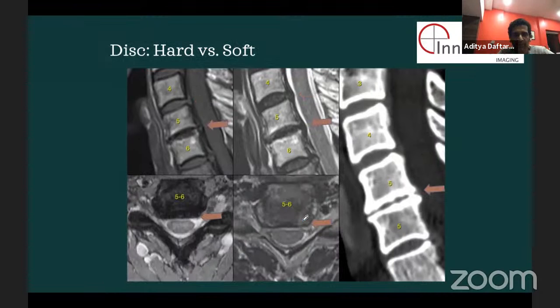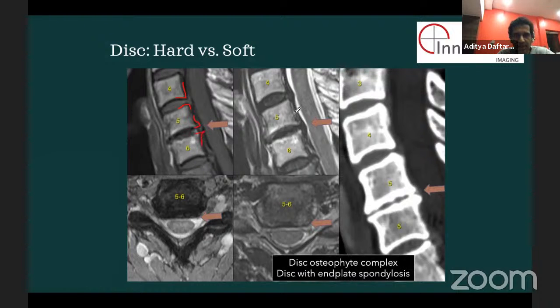Now, as opposed to when we go down and look at the level below, which is C5-6, you can see how this vertebral body ended here at C4 like this, as well as here at C5 like this. Whereas here, you can see it is coming out more like this. So it sticks out a bit like this, right? And similarly here, it does the same thing like this and like this, okay?